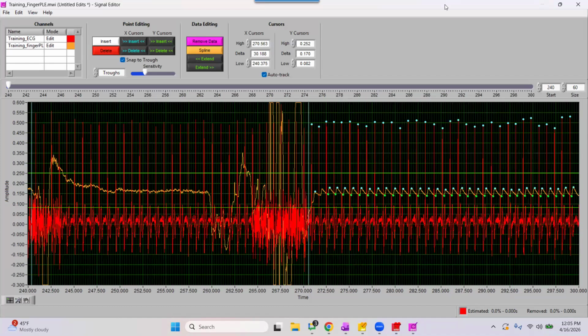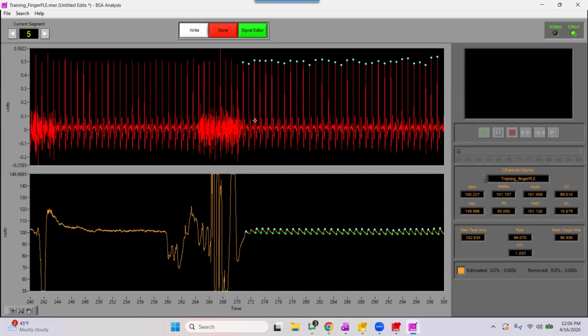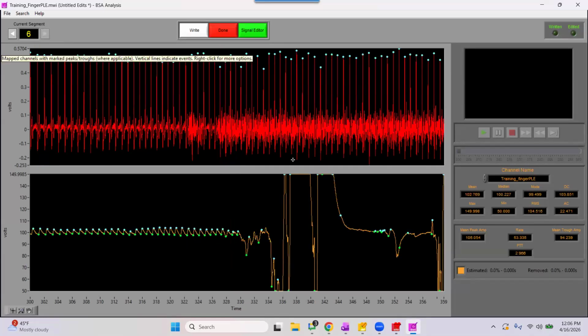As I scroll down and push this analysis window outwards, I was previously at a PTT of 2.421, but when I remove the section of data, we can see a drastic difference as far as this PTT shortening up, really removing the data that was most extending this PTT time. So again, similar to impedance, you'll go for the edits that are most impactful first to improve your PTT interval.